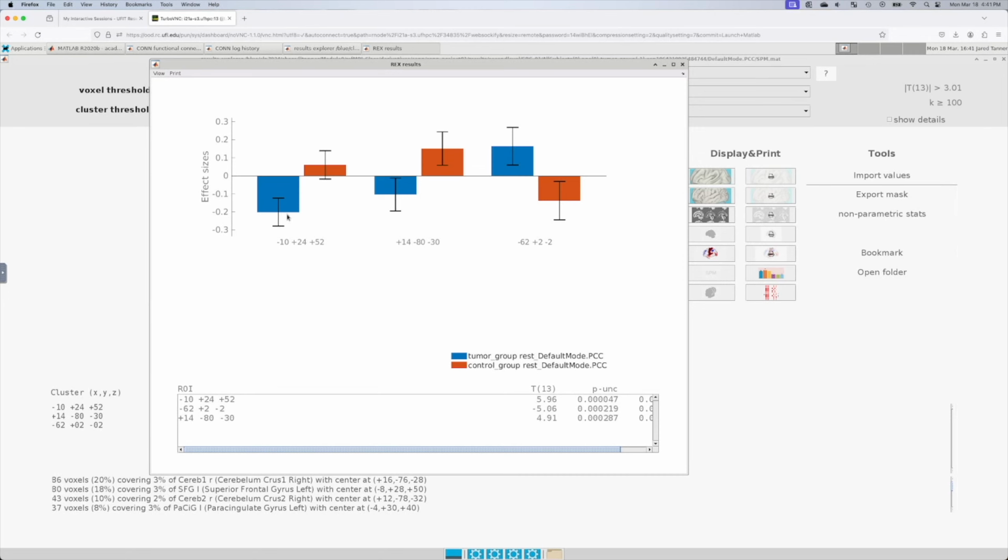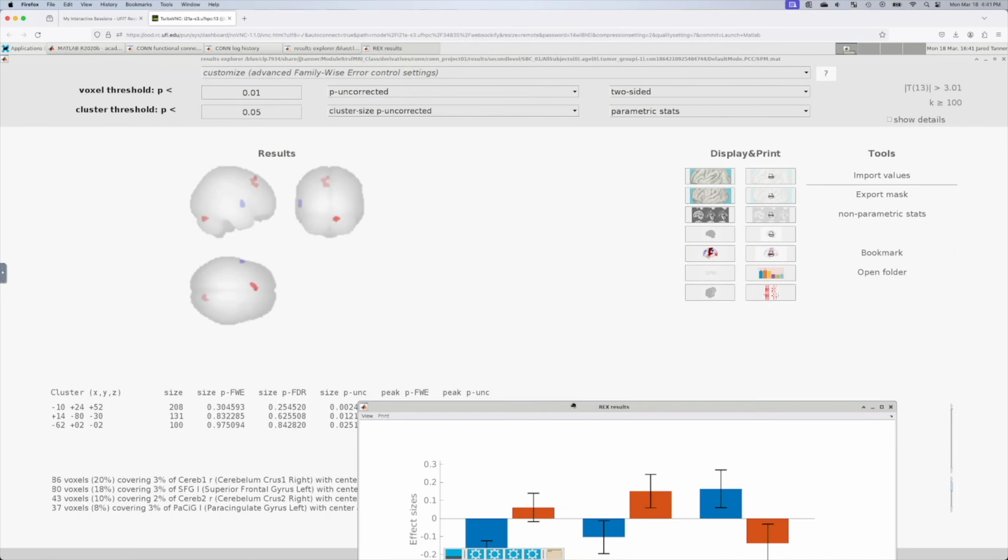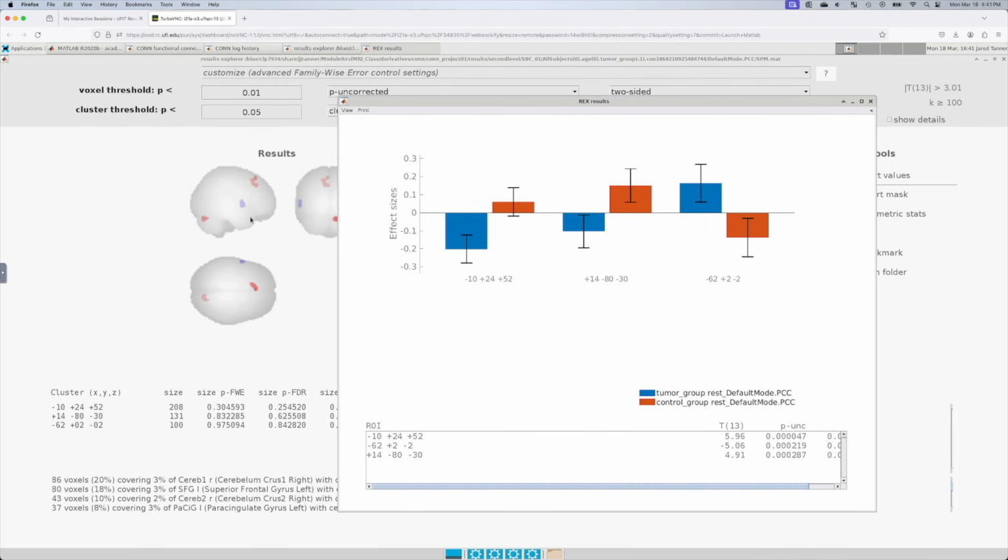It's just negative. And so it's a little confusing, and you have to be careful with some of these interpretations of results, because closer to 0 is less connectivity. And so you can actually have a really strong negative connectivity, negative correlation between areas. But this is an area, and I don't know which blotch it is. Well, I can click on it.